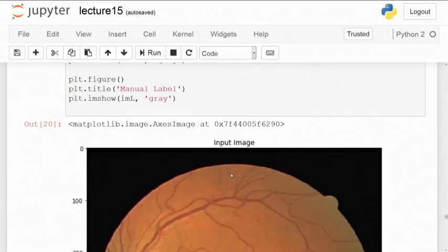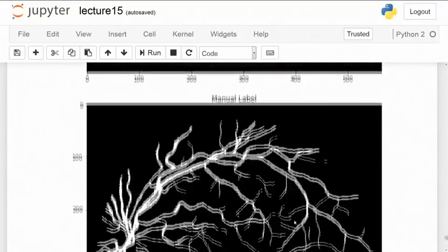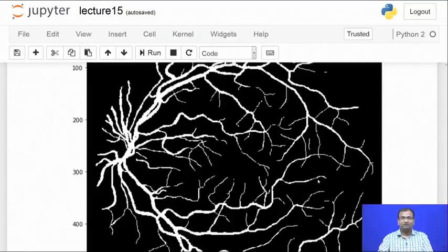You will have to train the autoencoder itself for larger epochs, say some 5000 or 10,000 epochs, and the classifier on that pre-initialized autoencoder also for an equal number of epochs, and then you can see pretty standard results coming down, replicating what we had over here. So, I would leave those kinds of exploration to you, as that would be too time consuming beyond what we have in one single lecture.